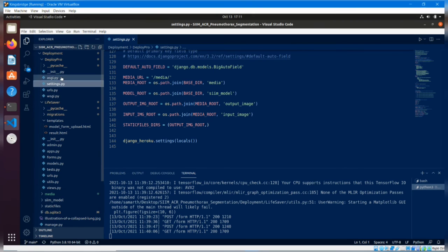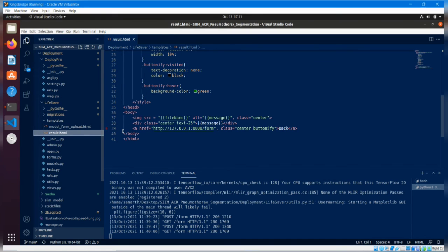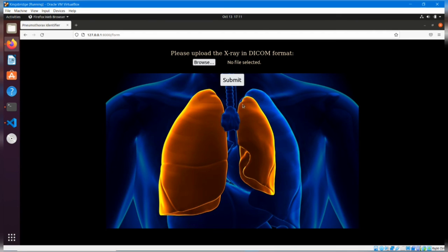There are a lot of other things also which can be seen more in detail. As you can see, this is Django. The backend is implemented in Django and the front end is very simply implemented as HTML. Apart from that, if you would like to see how the model is trained or the analysis of the model, then please look at the GitHub repository. There are a lot of notebooks corresponding to each type of study that was done as part of this case study.